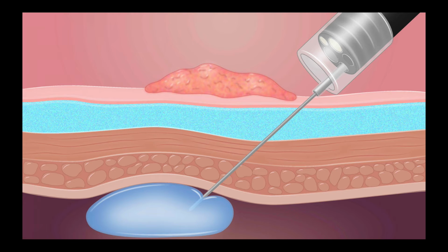If you do the correct technique of having the needle out and then puncturing the wall, and you end up with an extramural injection, you could easily find out by listening to what your assistant says as he injects the fluid. If he counts 1 cc, 2 cc, 3 cc, and you don't see a good submucosal bulge, that means your injection is through and through and you're depositing your fluid outside the wall.